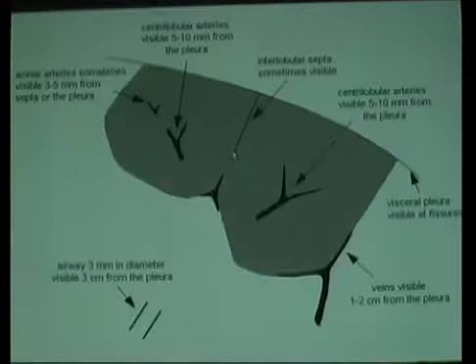So in point of fact, in a normal patient, when you look to see secondary lobular anatomy, it's actually very difficult to identify. What you'll see is a pulmonary artery that goes all the way out into the center of these lobules, but does not reach the pleural surface, which is the key to knowing that something is centrilobular. You may occasionally see a part of the septa, but oftentimes you don't, which means that if you look at most high-res CT images, you're not going to be able to identify secondary lobules.